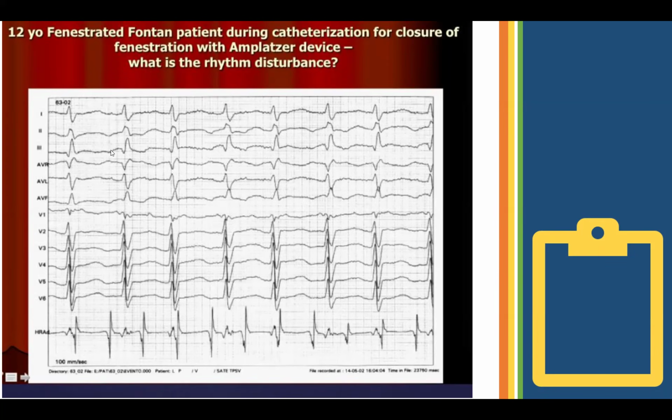Talking about this P wave here? Yeah. So I didn't see one with the beat prior. No, I don't show you very much before. But yes, I agree with you. You don't obviously see a P wave. Sorry that it's a little unclear. Let me just also tell you the ventricular rate, let's just say for the sake of this conversation, is 60.